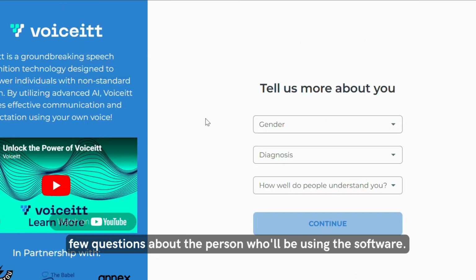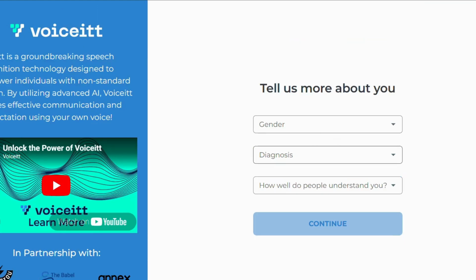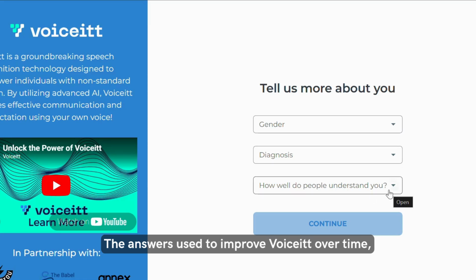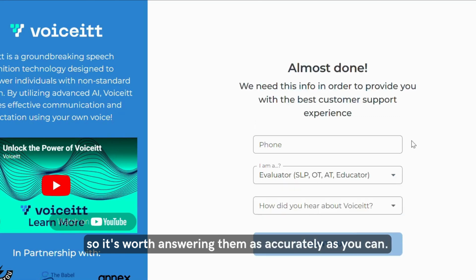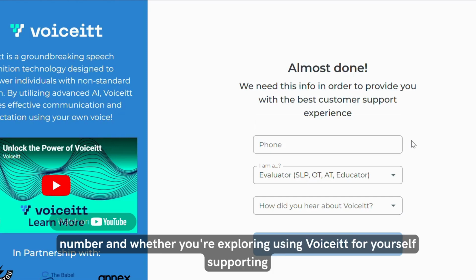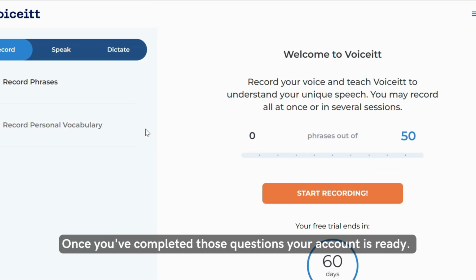Voiceitt will then ask a few questions about the person who'll be using the software. These include things like age, gender, diagnosis, and your communication experience. These questions help personalise your Voiceitt experience. They're also used to improve Voiceitt over time, so it's worth answering them as accurately as you can. You'll also be asked for some additional information, such as contact phone number and whether you're exploring using Voiceitt for yourself, supporting someone else, or using it in a professional role. Once you've completed those questions, your account is ready.